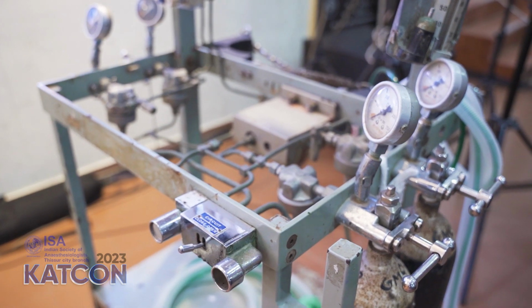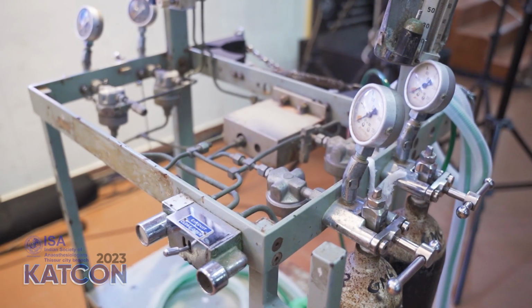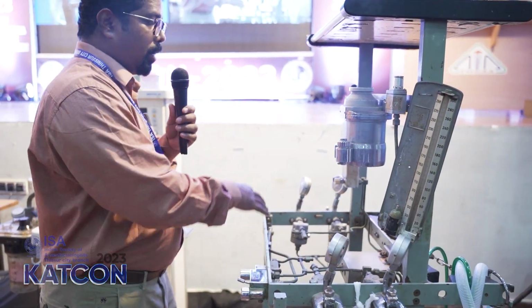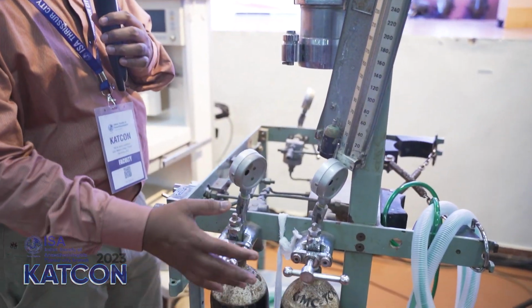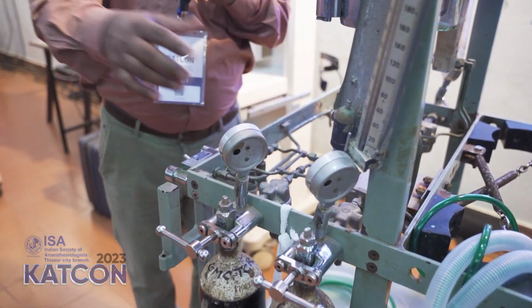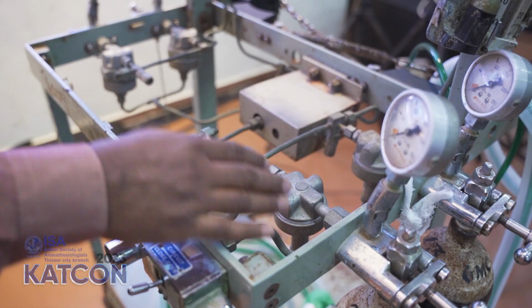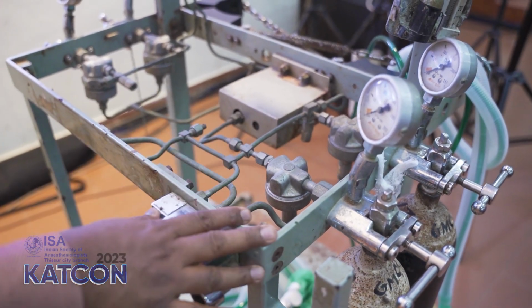Good afternoon, everybody. We will first show the parts of the machine, the old anesthesia Boyle machine. Here we have, as you said, three systems: high pressure system, intermediate pressure system, and low pressure system. So the high pressure system includes the cylinder, the hanger yoke assembly, the pressure gauge, up to the pressure regulator. Can you all see this pressure regulator? Please show it. This is the pressure regulator or the pressure reducing valve. This is the oxygen side, and here you have the nitrous oxide side. We will be discussing it in a bit more detail later.